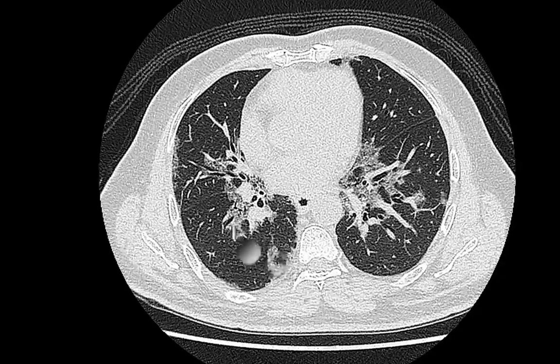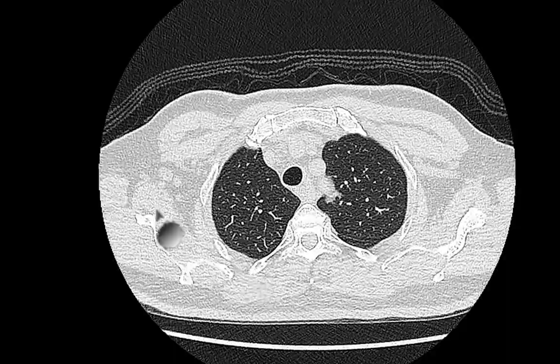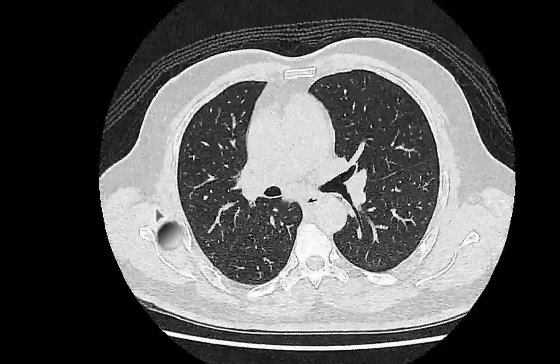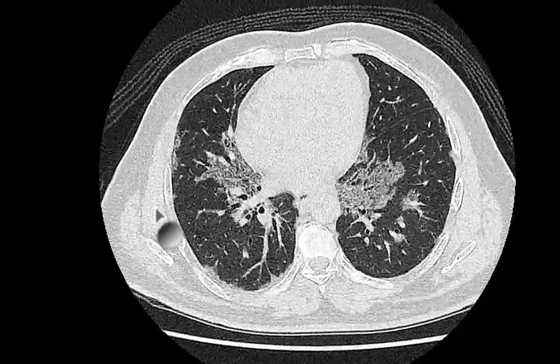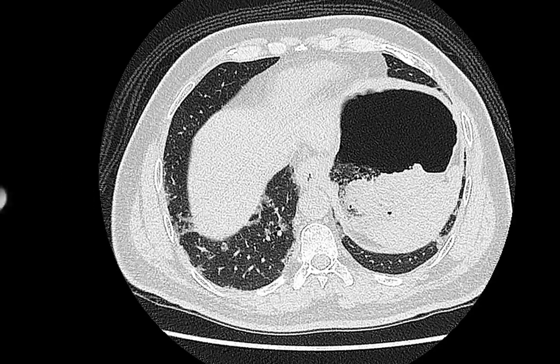In addition, you have the central perihilar abnormalities that surround the airways and vessels in what we call a peribronchovascular distribution. So to summarize your findings, you have a multifocal, bilateral, subpleural, and peribronchovascular abnormality that's mainly constituted of ground glass opacities with areas of crazy paving, and that have a lower lung predominance.